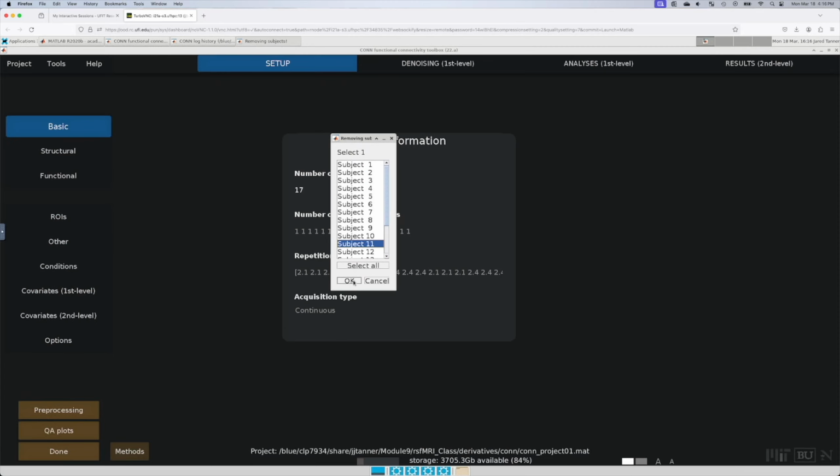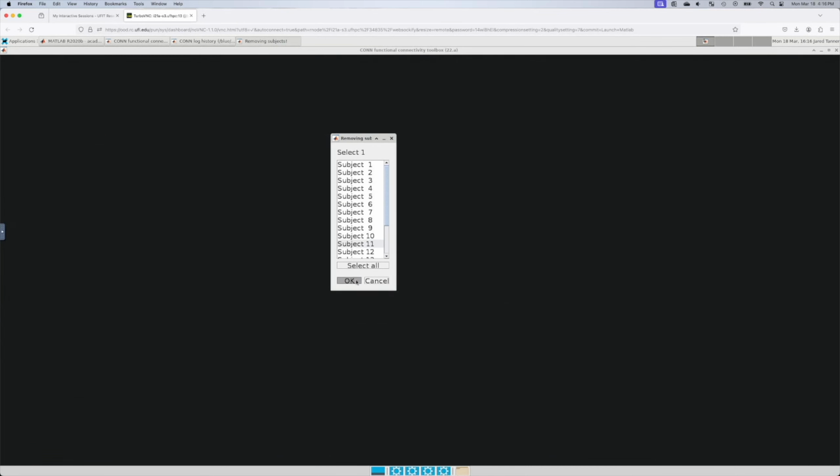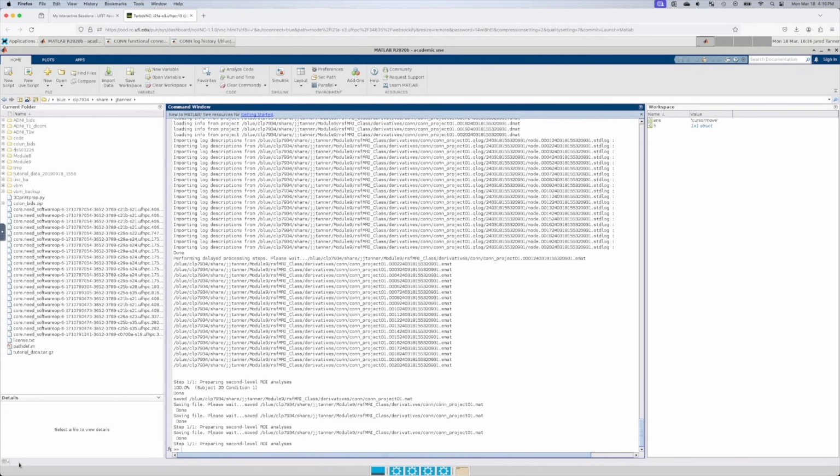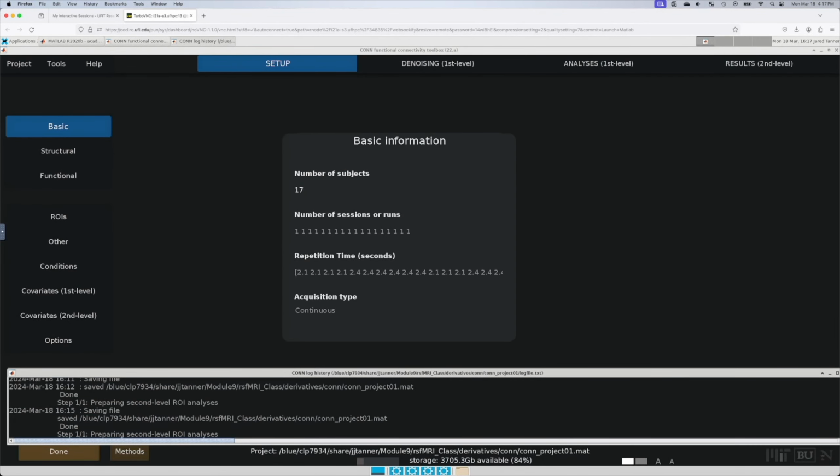Again, this only works if you're doing it from the subject 20 on down. If you're going the other way, you're going to have to change who is who because everything will kind of move up one subject. And so subject 11, hit OK. I will take them out. Again, this is going to take a little bit of time. It's showing busy right now, so this takes a little bit of time. And then once that's done, then we'll take out the last person and keep going.